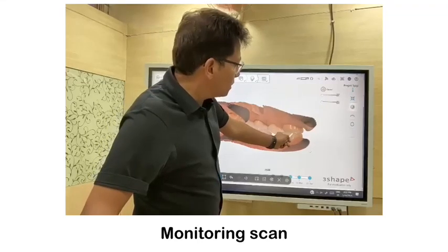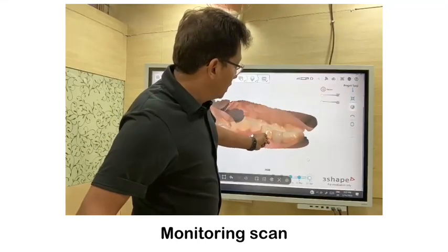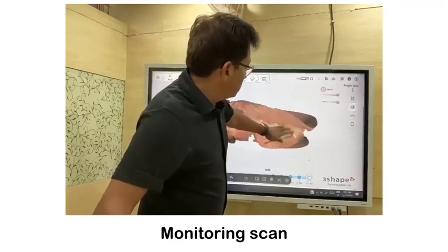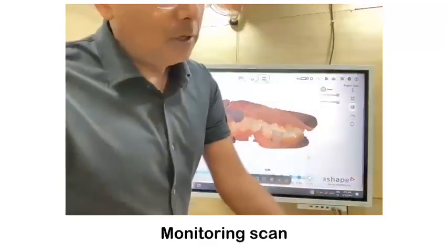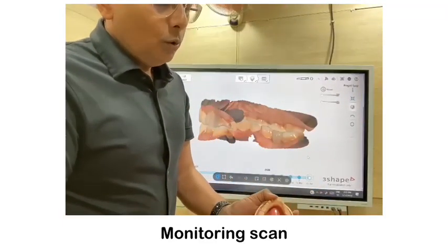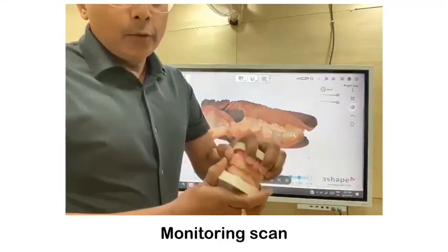This is a slight space. Maybe some part of the tooth is touching here, some part of the tooth is touching, but what we want is ideal occlusion. So we have to rebuild and give occlusion locks. Once we give occlusion locks, the hit and slide is reduced. Once hit and slide is reduced, the teeth don't get damaged. So TMD is automatically corrected or reduced. So this slide is to be reduced.